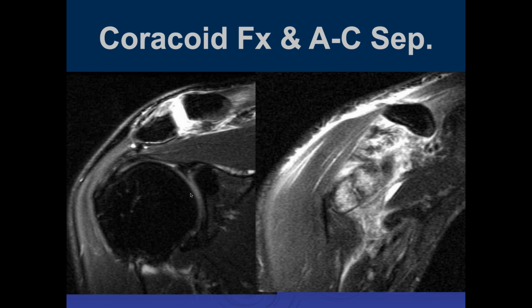Thanks, John. So in this case, in the first image, we see capsular injury of the AC joint, mild separation, and capsular disruption. On the second image, it looks like we see a fracture through the coracoid, as well as marked signal and irregularity where the CC ligament should be. So it's completely disrupted, it looks like. Yeah, it might actually just be the growth plate.